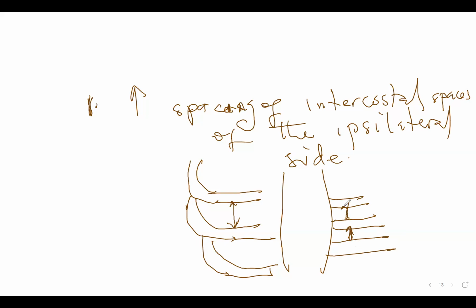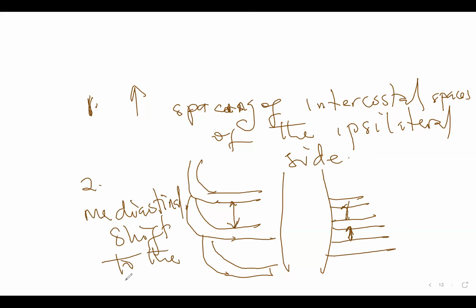Okay. Number two, there's mediastinal shift to the contralateral side. Because the pressure is more here, it pushes the mediastinum to the contralateral side.